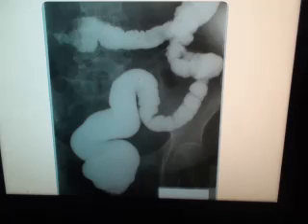Here, this is another type of barium enema. This is the rectum, sigmoid colon, descending, and transverse colon. And here you can see there is an arrest of dye at the area of hepatic flexure or transverse colon with shouldering and destruction of the mucosa and failure of the dye to pass to the rest of the colon. So your diagnosis should be obstructed cancer colon.